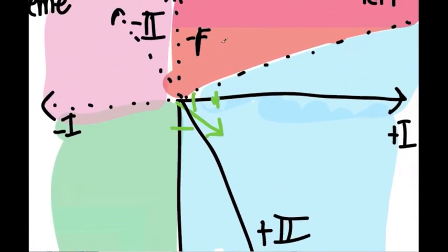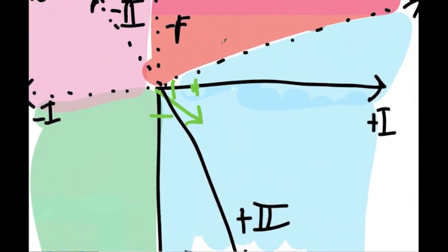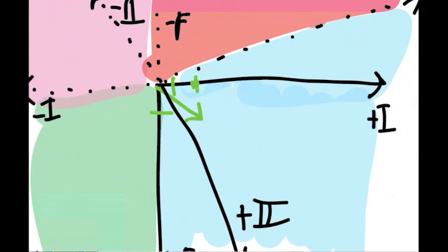Let's zoom in there. So anytime that we're on this side of that divider line, we know that we're along the positive 2 axis. So positive 2 gets us on this side of the divider line and in the normal axis zone. If 2 is negative, we know we're over here and in the left axis zone.